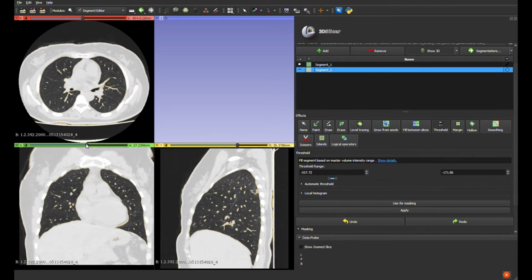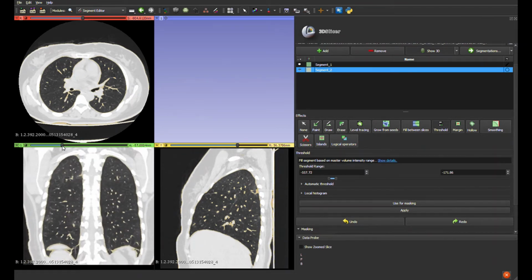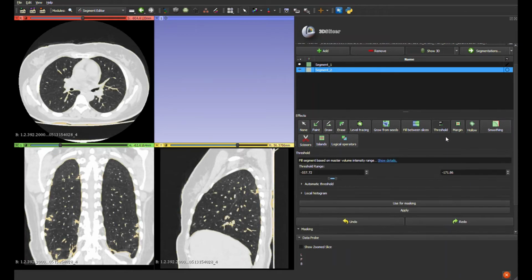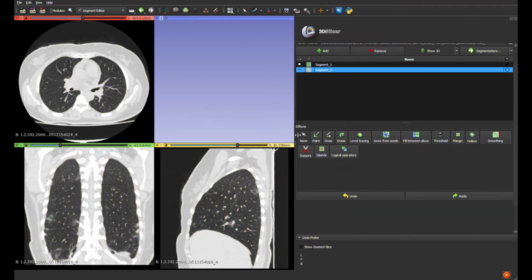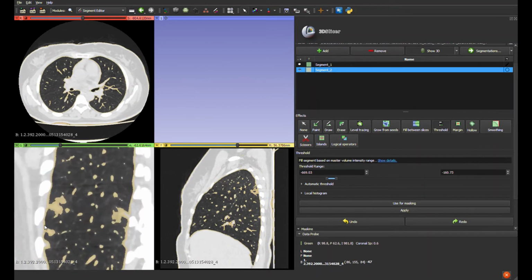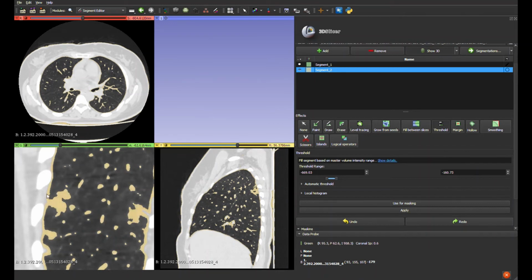So let us first pick a view with maximum lesions. In this one we can essentially choose the same threshold technique. The lesions seem to be over here, and we need to go to the threshold to ensure that, if you see here, all the unnecessary things are also marked, so we need to narrow it. Even if they're marked, it's okay.